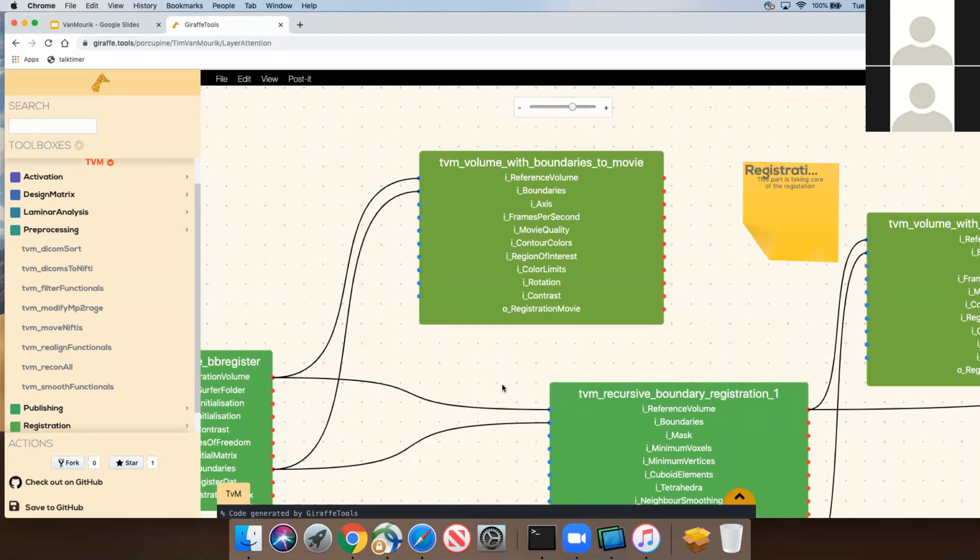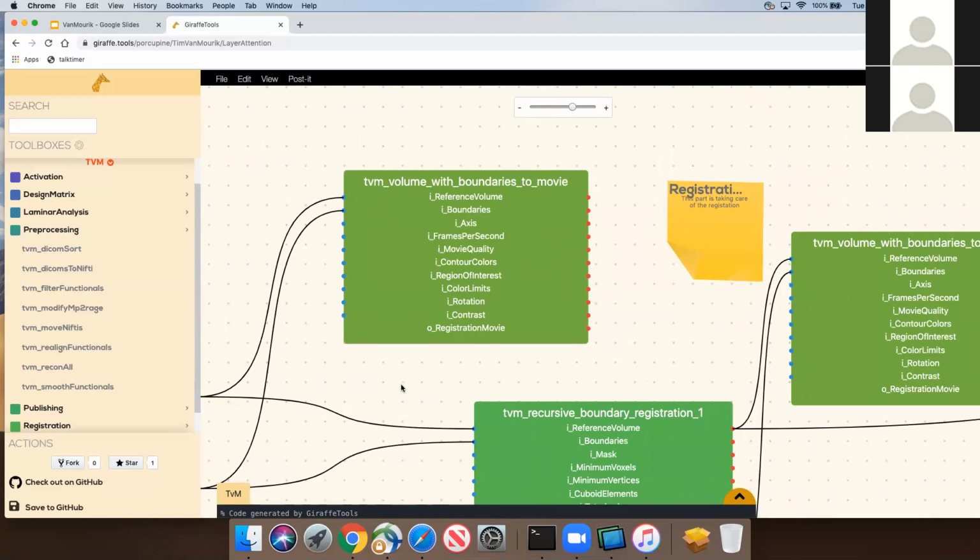And one of the things I'm quite adamant about usually is that it's very important to save the intermediate output of those files to something that is very easily inspectable. We had a short discussion about what is good enough in terms of distortion correction. My opinion is that whenever you don't know when something is good enough, at the very least, you can write a pretty file, like a little movie file with boundaries.